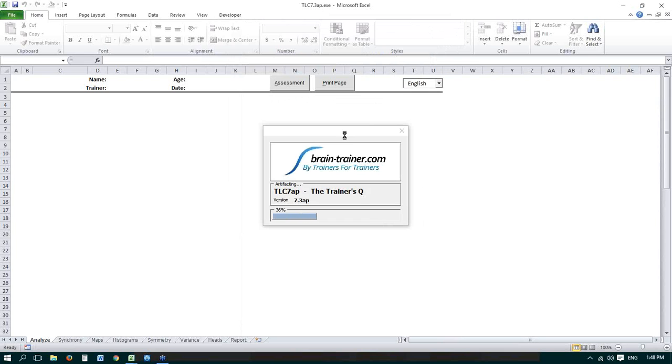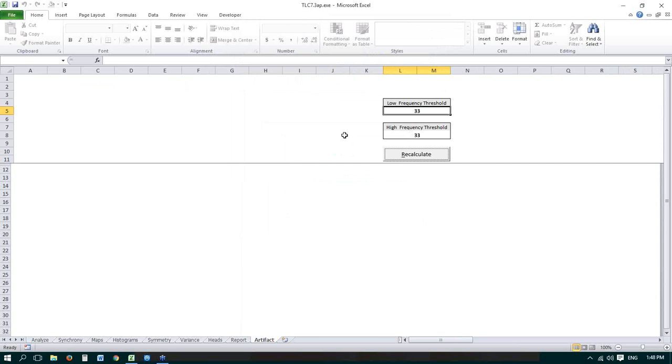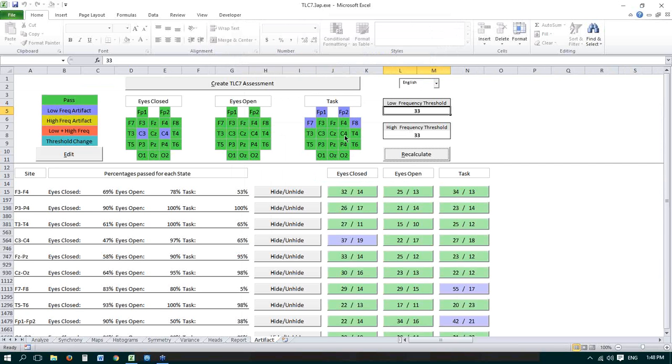And it takes a little bit of time. We're going to actually have to go through a step here that you wouldn't have to go through. In Infinity, you can do your artifacting in Infinity as you would normally. In this case, there is an actual artifacting step that's included. That's why it's taking a while. It's going through and looking at each second by second to decide what the values should be and whether to make changes or not.